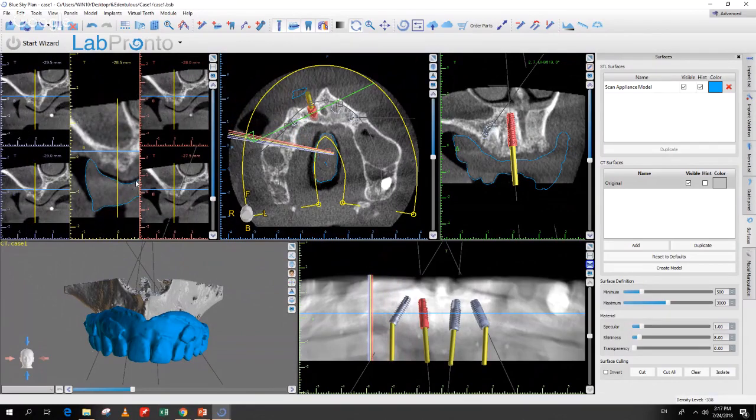separation. I'm pointing to the top left, to the middle image. The black that we see there is emptiness. It's space. It's air. There's no connection between the denture and the patient's anatomy. So this surgical guide, as is, if we converted it into a surgical guide, is not going to sit properly. That's a very important point. It's a good way to confirm that the fit and the seating is done properly.